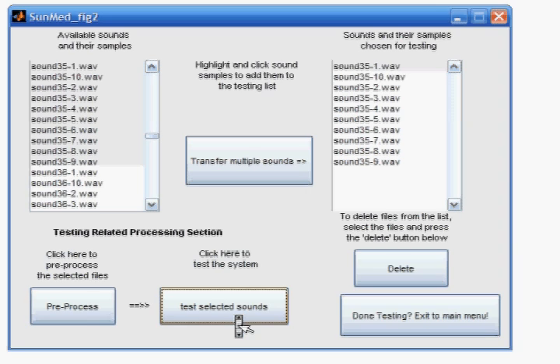Once the user selects to test the selected sounds, it can take up to 4 minutes for results to be displayed on an average laptop computer. Given a faster computer, this process would be sped up considerably. One important thing to note about the test sound selection process is that in the final version of the program, this sound information would come directly from the patient via digital stethoscope, directly into the computer, with no manual entry required.